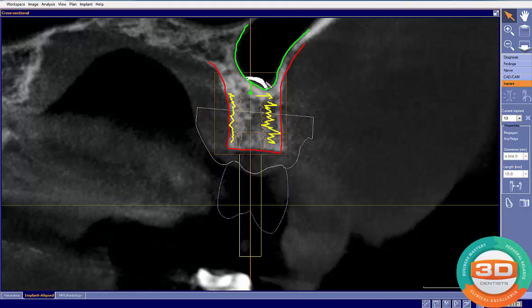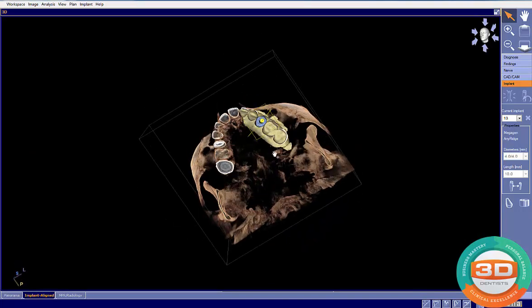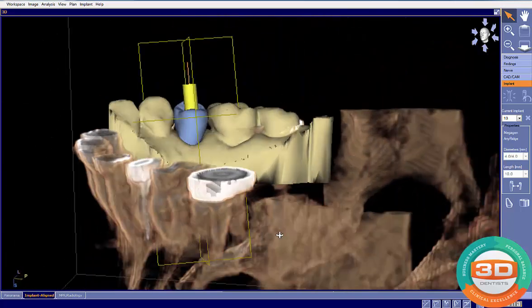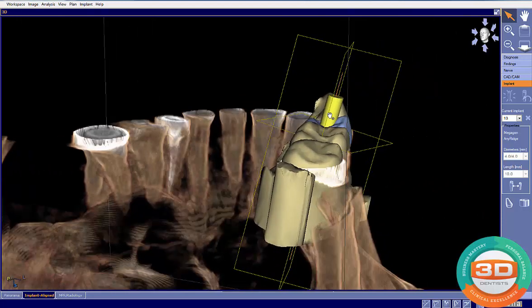And then the other thing I would also do, just while I have everybody here, is take a look at this and see that that is where our implant alignment is, like this, to make sure that our 3D design on our CEREC side is correct. So let's go ahead and take a closer look at this. One of the things I like to do in evaluating my designs is to see if it truly needs to be at the angle that we designed it at.